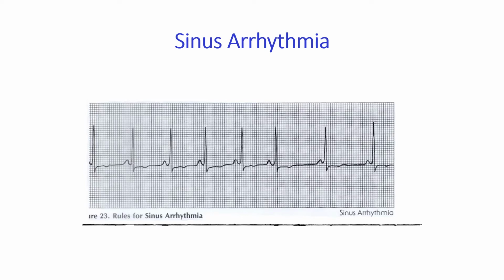This is just an example of a sinus arrhythmia. Again, if you do your R to Rs, they're irregular. So that's what defines a sinus arrhythmia.